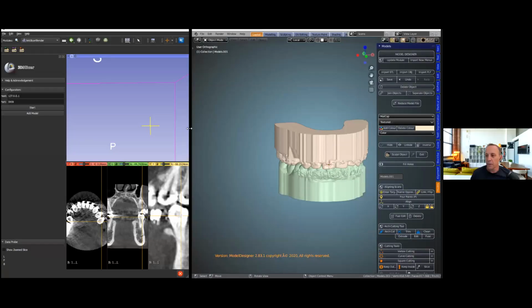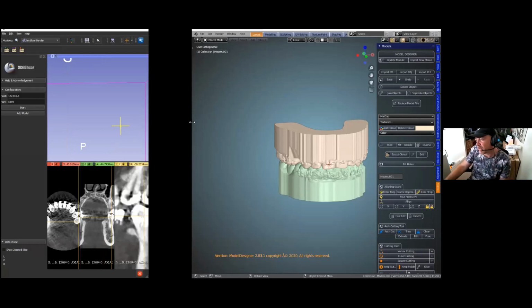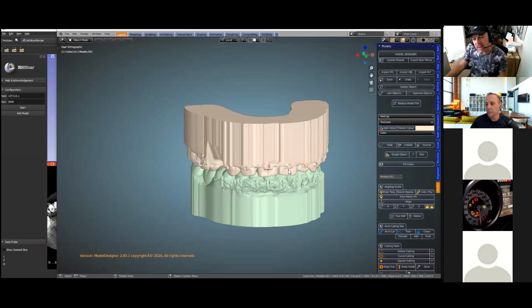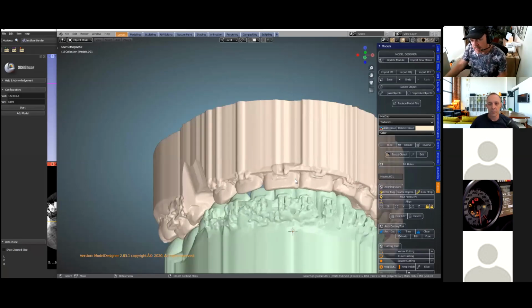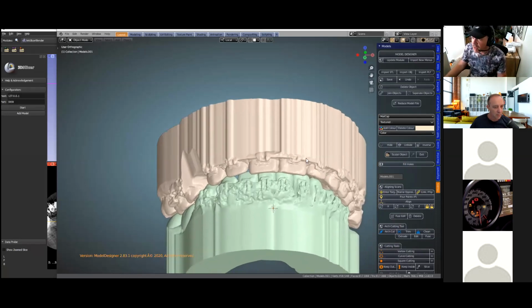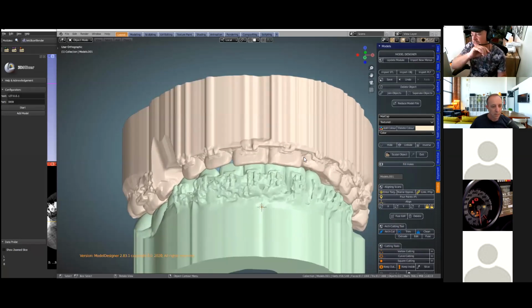Okay, go for it. All right, so as I've said before, knowledge of making our models is crucial. This model, for instance, was really difficult to make, and that's because we've got these orthodontic bands, which cause complexity in cutting the model. In order to arch cut a model, usually we just put the arch cut down and then we trim the model.